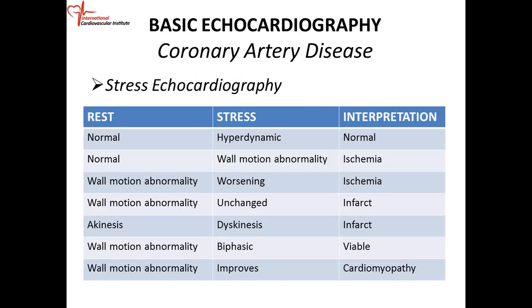So you're going to look at your ECG, you're going to look at the ST segment, and you're going to see if the ST segment is depressed. We usually talk about 3 types of ST segment depression. You can have a downsloping ST segment depression, horizontal ST segment depression, or upsloping ST segment depression. So those are things you're going to look for.